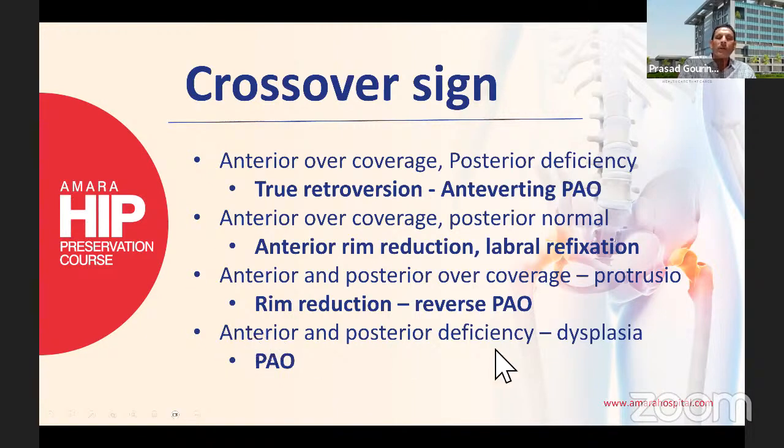If both the anterior and posterior walls are deficient, that's classic dysplasia, and you do a standard PAO, not the reverse PAO. So it's very important to differentiate which type of acetabulum there is, because it's a different treatment for the different type.